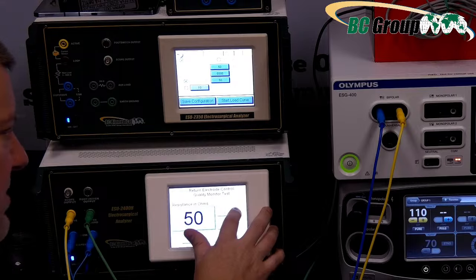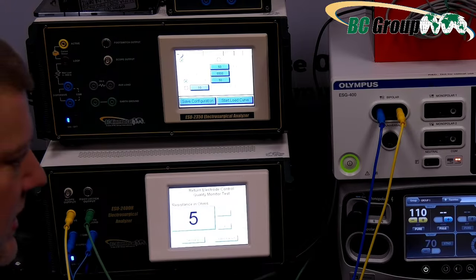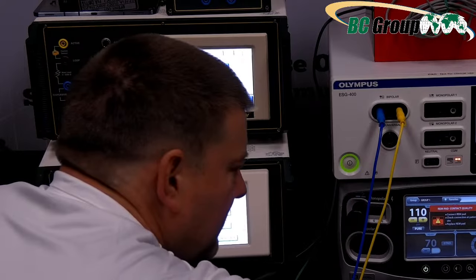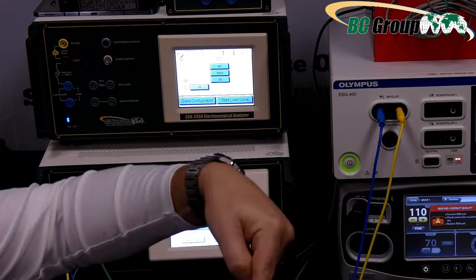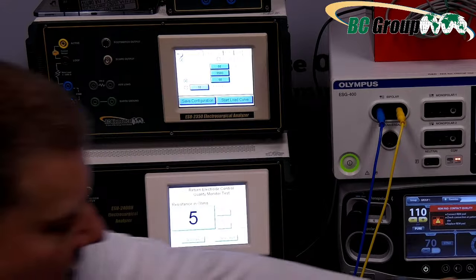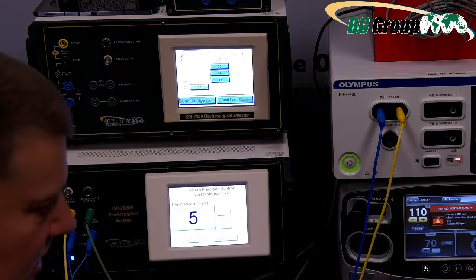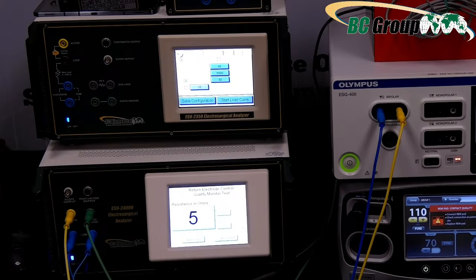And this guy here is not going to be happy until it's below 10 ohms, because my dingle hopper is missing. The little pin that's supposed to sit right here contacts a little micro switch in there and tells you, hey, I'm a split electrode. But you guys get the point.